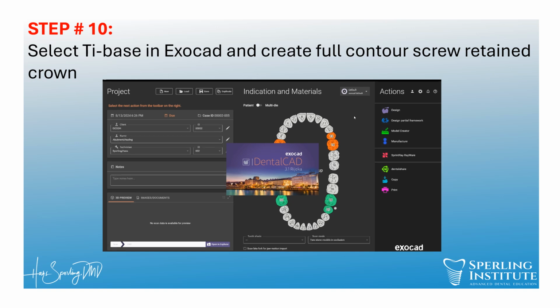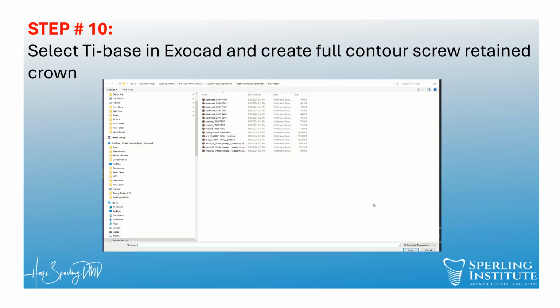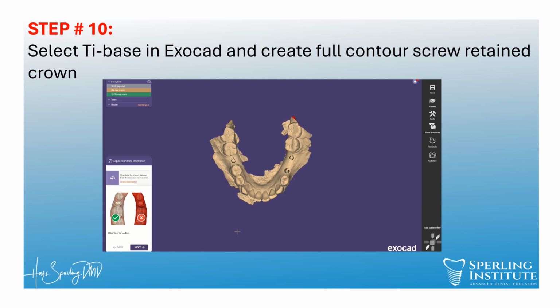So this is regularly how I attach implant crowns. This is my workflow for designing implant crowns. I first design a Pontic, and then I fit the Pontic to my Ti base. It's asking us to load our lower jaw scan, which is the lower jaw scan with the scan bodies. It's asking us for our wax-up, so our wax-up is the Pontic wax-up of 19, 20, and 30. It's asking us for the antagonist, which is our upper jaw. We're selecting which side is up.